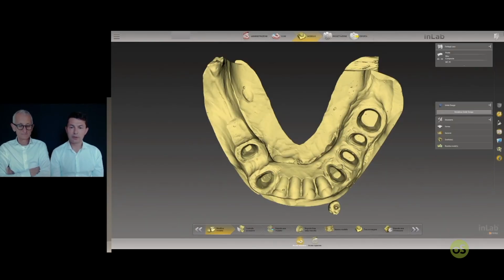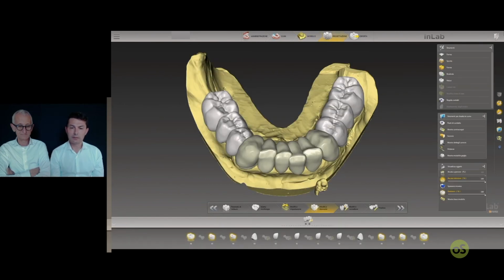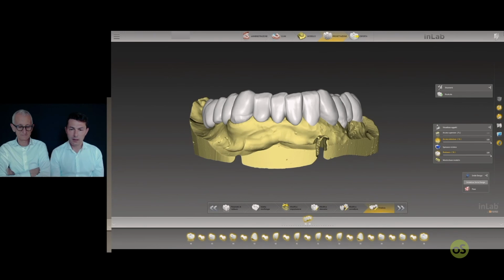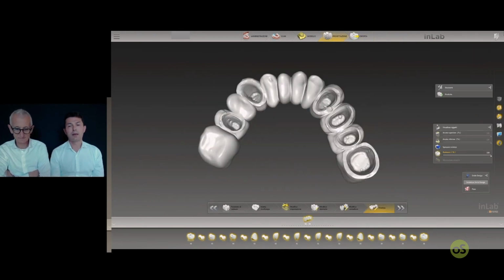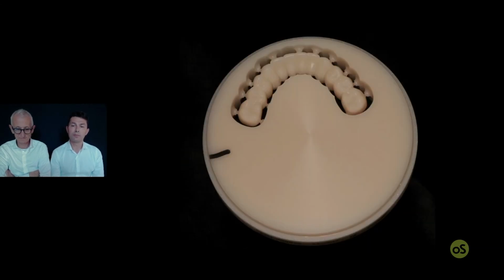Start with the acquisition and prep some teeth and start with the shaping of the full arch lower. Check again the occlusion. And now the restoration is finished, it's time to mill in the disc. And after the process, you have a completely empty restoration ready for the surgery.